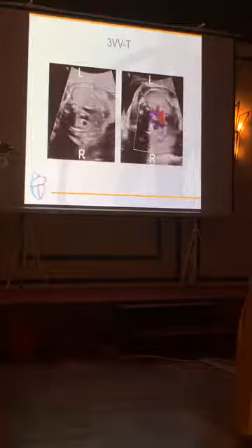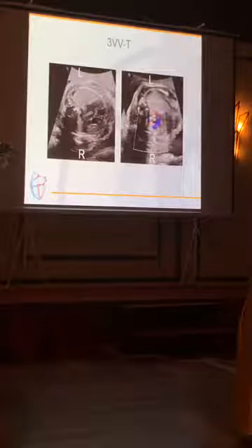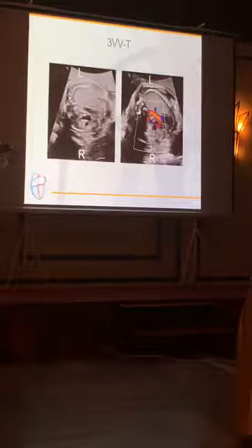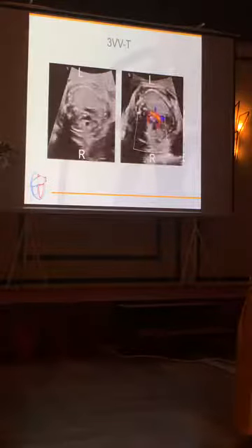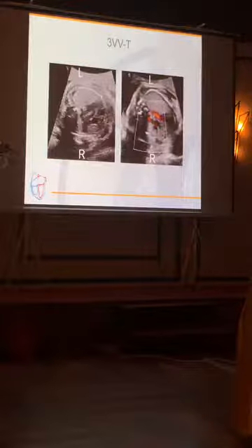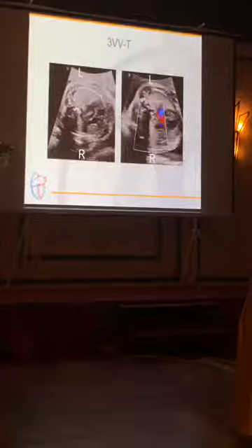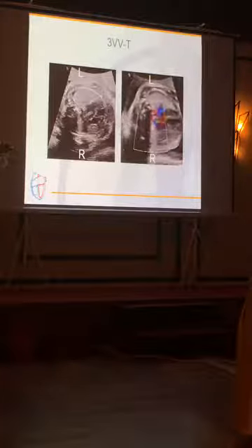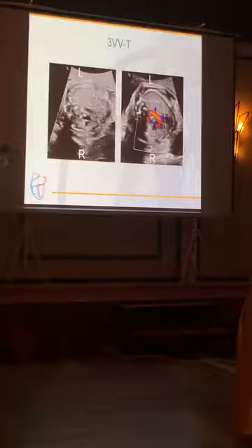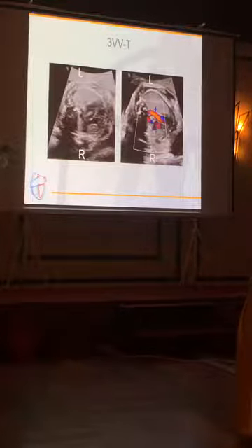Okay, next set of images, sides, as you can see, left and right. Any ideas? Yeah, I can hear someone. Right aortic arch. Yeah? But when you say right aortic arch, it's nice to tell something about some other vessels. So first of all, where is your ductus arteriosus? It's still on the left side, but in some cases the right-sided ductus arteriosus is present. So which condition is better?